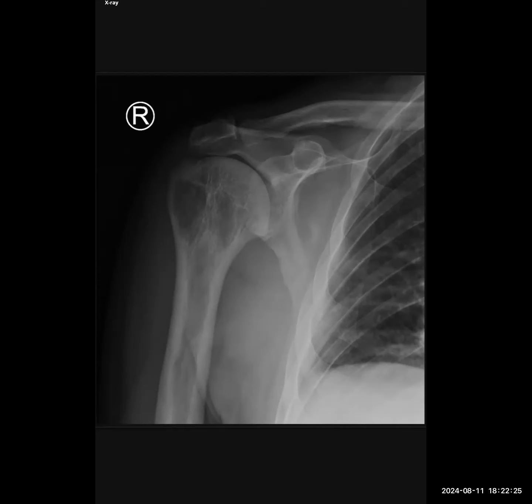The visualized portions of the scapula and the distal end of the clavicle appear normal. The acromion, the coracoid process and the acromioclavicular joint are relatively unremarkable. You can ignore that. The rest of the lungs appear unremarkable. Also, the ribs are normal.